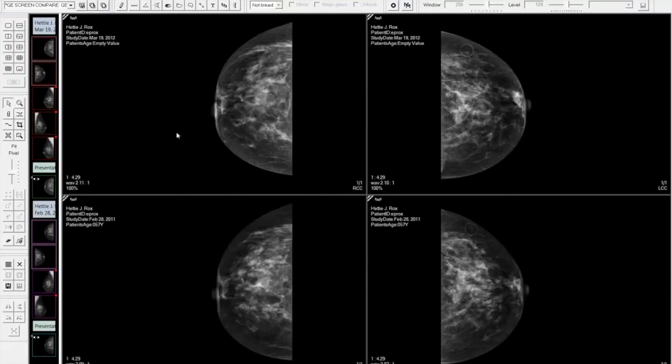Now obviously for digital mammo, I'm going to want to open the prior almost always. So now what we have, notice in the top left, it's GE Screen Compare. So I have chosen to display the images differently when I open a current exam and a previous exam.